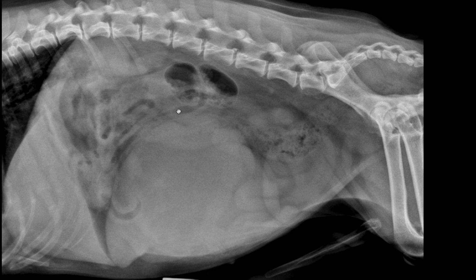Now, the way this mass is displaced in the intestines and its location, which is to the left of the abdomen and caudal to the liver and stomach, is indicative of a splenic origin. And this shape here that I mentioned, the triangular projection of the mass, I think that is just some part of the splenic tail which still maintains its normal shape.